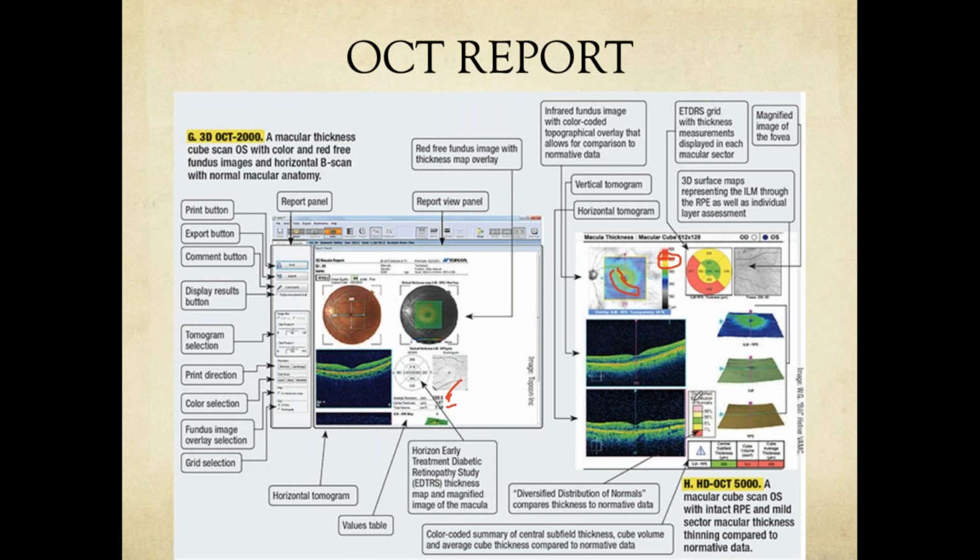So this is the other clue the OCT images can provide to you in determining if that pathology is a dystrophic pathology, or is it a vascular, or is it some other retinal pathology. So this can also give a clue.